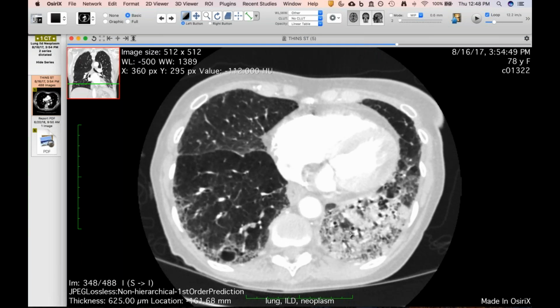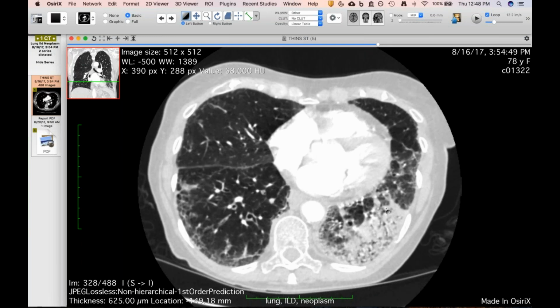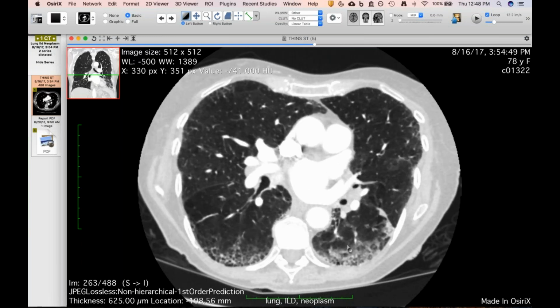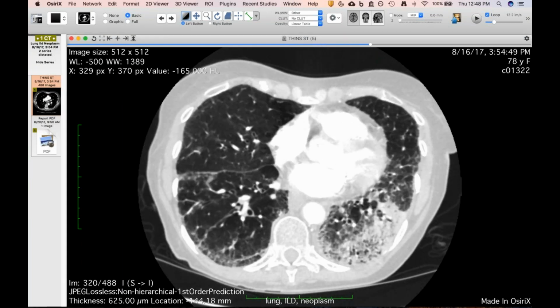And of course, we went through the discussion because this was the only time point we had. Certainly she could have had an acute pneumonia or aspirated here, but she was an outpatient, she wasn't ill. Yeah, and so those are, of course, findings that should raise alarm.